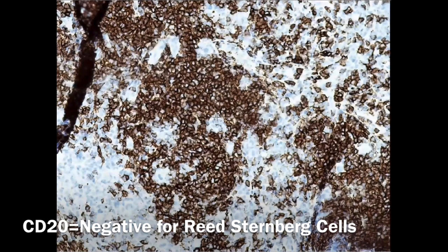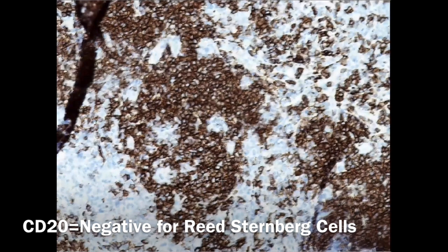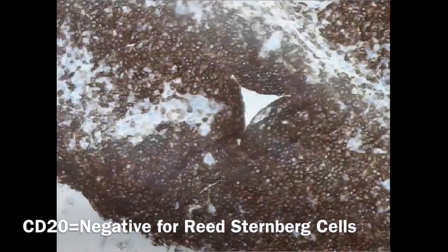So this confirms that the size is important, it's large, and the borders, they are not uniform borders. So we have a gap here. So this is not taking the stain of B cell. Another two cells here, and a gap is very evident between them, showing that they don't take the stain. And another cell here, again, with no membrane, or it's not taking the stain. These are the Reed-Sternberg cells. So we have positive CD20 for other B cells, but not for the Reed-Sternberg cell.